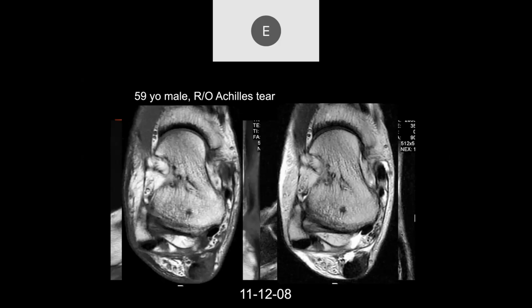Yeah, okay. I'm seeing edema anterior to the tendon and some irregular signal within the tendon fibers. The tendon itself is rounded. It's not the normal comma shaped. It seems to be a little displaced to one side.